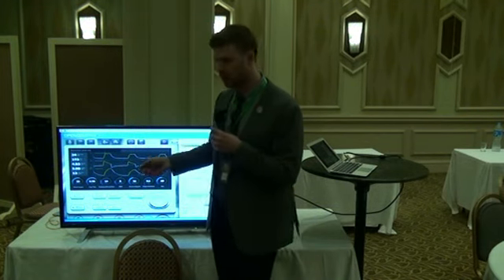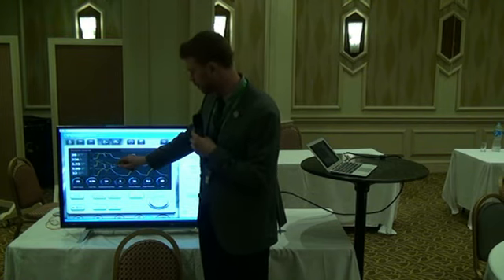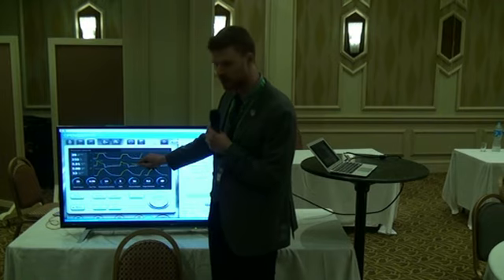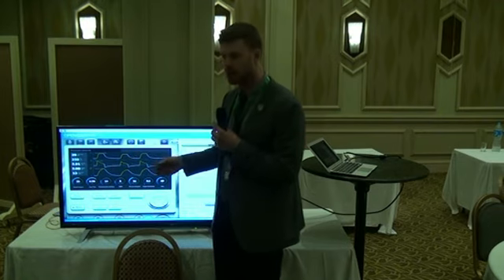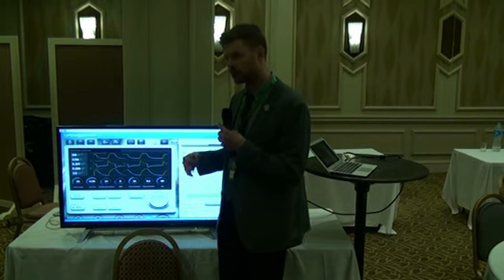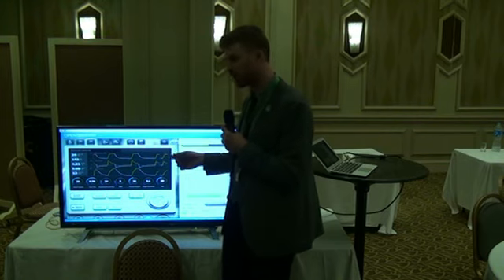So everybody notice this. I would call this flow chop on the inspiratory portion. We have the increase in flow, and then right before exhalation, it doesn't reach baseline, right? It doesn't go back to zero. So that means if we increase the inspiratory time, we would get more volume for the same pressure. And that's a function of the time constant, resistance times compliance. So in this case, probably high resistance, and that's the problem.